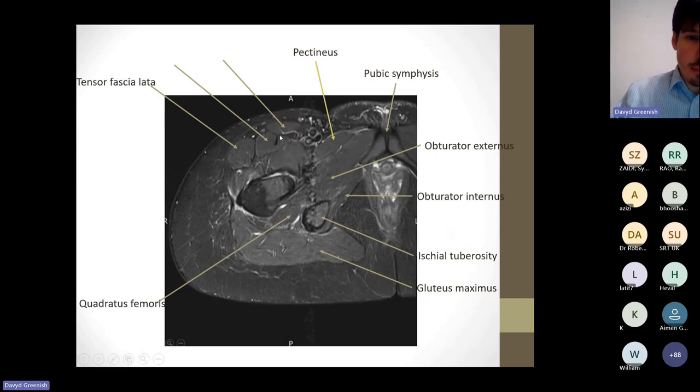We've then got this muscle here. It's got this odd black line through it. So we've talked about the tendon previously. Cameron's talked about the tendon within the muscle, so we talk about a myotendinous junction. That's just the way that the muscle and the tendon attach together within this muscle. So this is the rectus femoris muscle. It's got that really characteristic black line down the center of it. It's a bit of an odd configuration with its myotendinous junction, so that's quite characteristic.